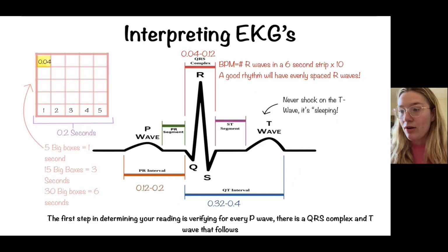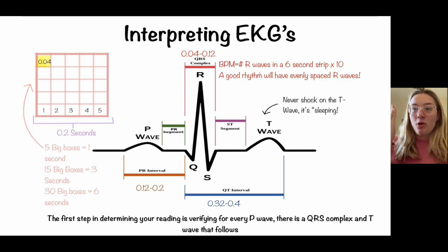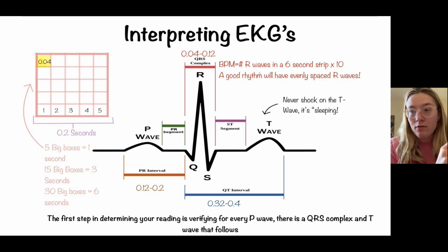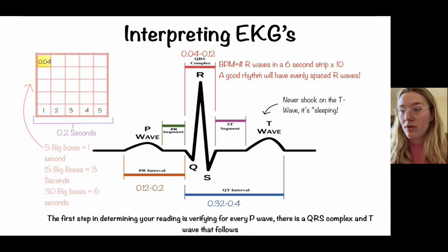Additionally, if we're trying to figure out if our EKG is normal, for every PQRST complex, we want a nice even R to R interval. We're looking for a uniform distance, okay? Even if my beats are back to back to back, if I look at each of my R to R, and it is the same distance, the same number of seconds between each R to R interval, that means the underlying rhythm itself is normal. It just might be going too fast or too slow.